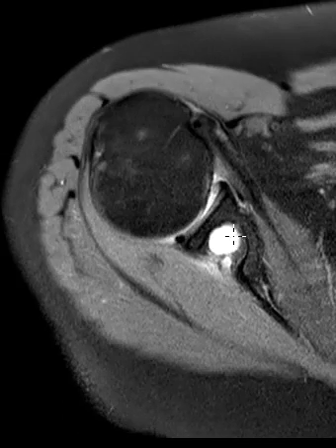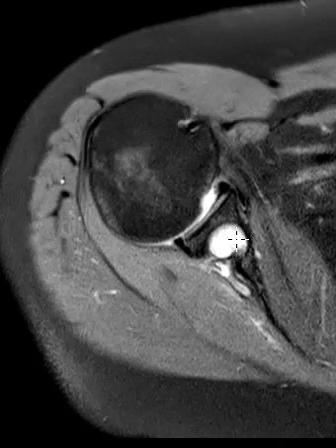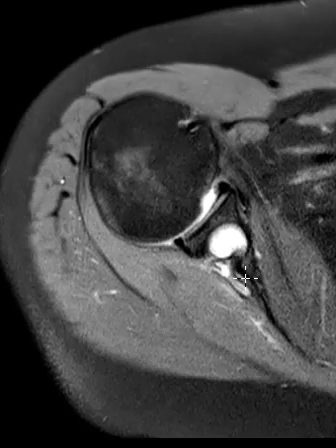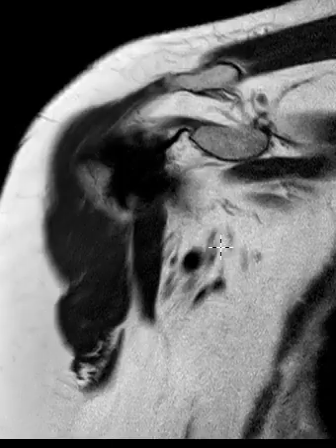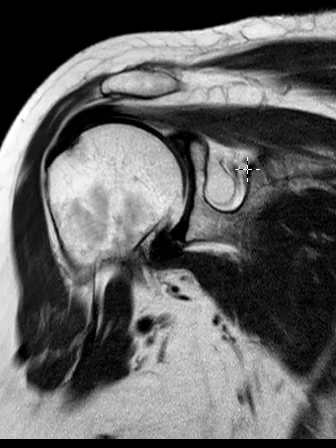It's not multiseptated. Most often the ganglion cysts or the paralabral cysts will be more septated. This is just one collection, and since it does look like it communicates in that one view there, a varix is also possible. It would be a long-standing thing. You can see how well it's eroded, and this does look pretty unusual too. You see these not terribly infrequently, and this definitely has a more peculiar look, this sharply defined margin. So again, this may be a varix since we saw the communication, and then this very curious look.